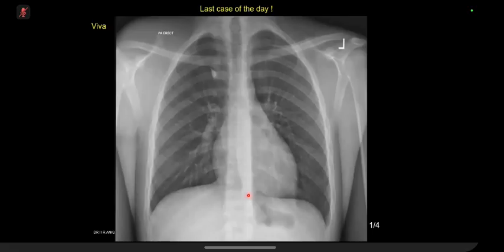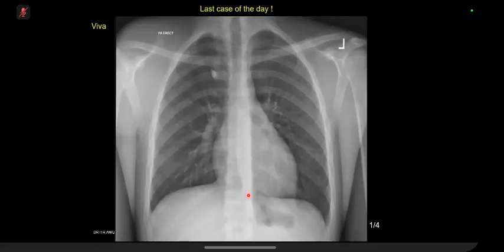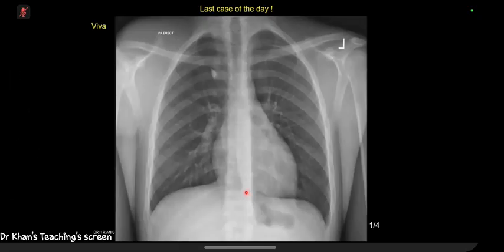So this may be a soft tissue lesion of the right. Anything happening to the scapula? There's some lucency around the superior glenoid, superior angle. Yes, so the spine of the scapula, there appears to be an aggressive periosteal reaction on the right-hand side.